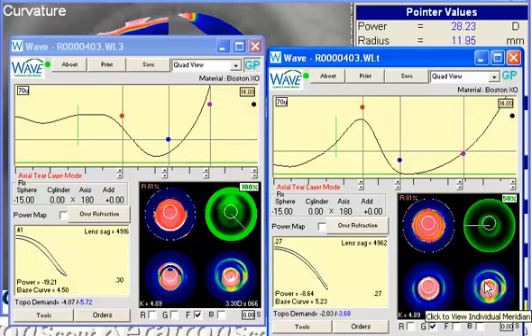So if we look at this cornea, this topography, I'm going to try to get that zone a little bit more closely in here. So I actually brought it down the size of that a little bit, bringing it closer into maybe in that 5, and then the second zone I put about 7, maybe about in that area, more or less, just because I want to leave enough room for this landing area out here. And then I went over here to this nice little design tool.